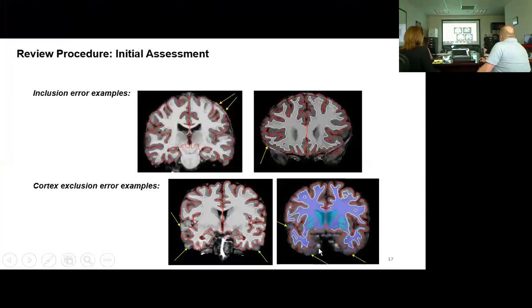Is this a different scan? That's a different scan. Yeah. So here, this is something similar where the white matter volume is overlaid, and you can see that even here, there's actually blue there. So that was labeled in the segmentation stage as white matter, but FreeSurfer, for whatever reason, did not continue the surface out there. So that's where the mystery comes in.